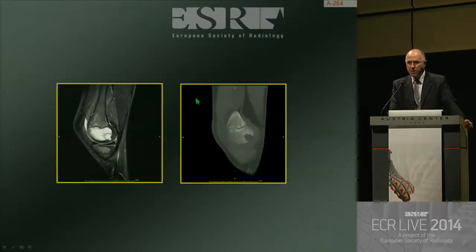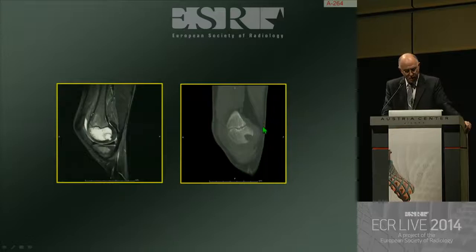So what are we talking about? Just a quick example. This is a patient who has an infection within his distal femoral epiphysis. You can identify with one imaging modality the site of osteolysis. You can also identify some osteosclerosis around it, so you can identify the bony response to osteomyelitis. What, of course, MR shows you very nicely in this fat-suppressed image is that the normal marrow is suppressed, whereas the edematous marrow involving the whole of the epiphysis now shows you the myelitis component. So both are seen and both are important in assessing the degree of bone change.